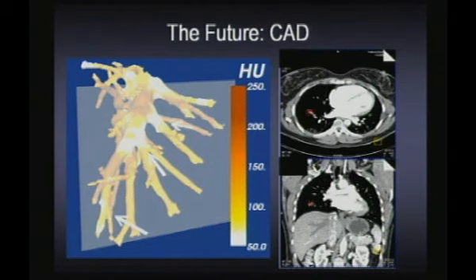It's freely rotatable. The objective is to demonstrate areas of higher concern that may then be clicked on, and we go to an orthogonal projection of CT images through that region that may help us in our determination of pulmonary embolism. There are also some newer CTPA CAD tools that help to identify small pulmonary emboli in the periphery of the lung parenchyma. And these techniques hold hope for the future, but are still probably in their infancy.